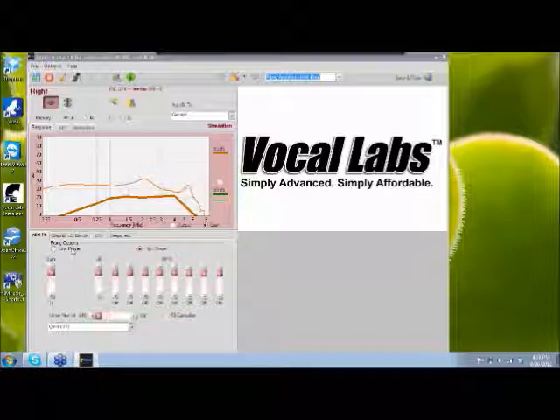If you are using a low power receiver but you leave it on high power, when you do your auto fits, the software thinks you have a receiver that is actually doing 25 decibels louder than the receiver you actually have on is doing. So you want to make sure and pick this very first thing. I am using a high power receiver, so I want to leave that there.